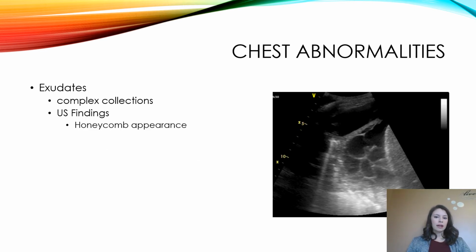Exudates: this is a complex collection of pleural effusions, and it's the honeycomb appearance that you see here. That can be caused by hemorrhage or infection.